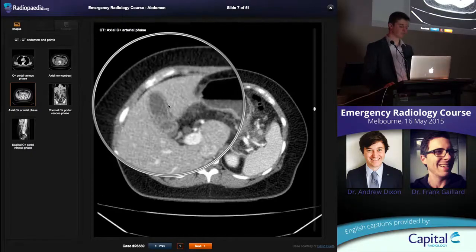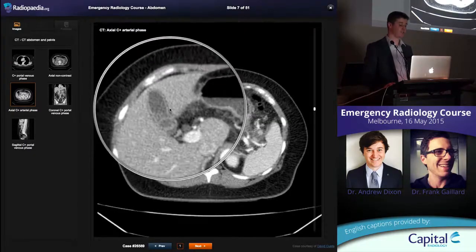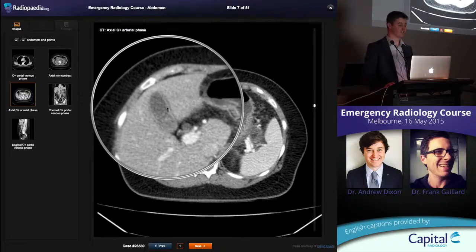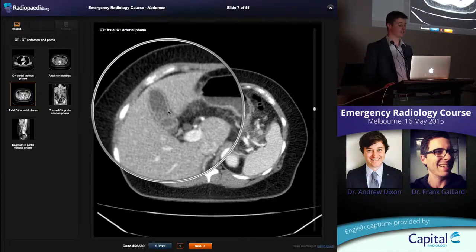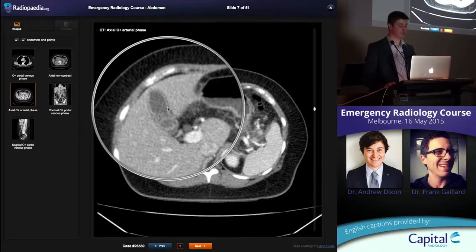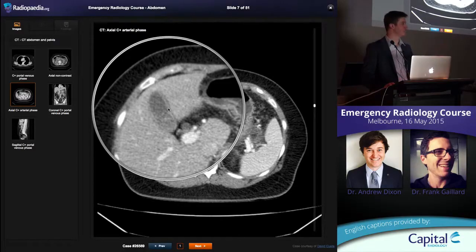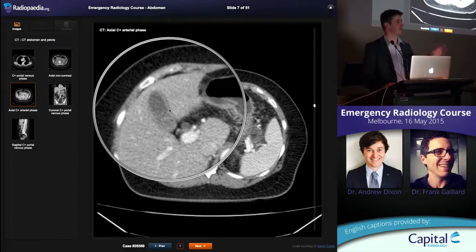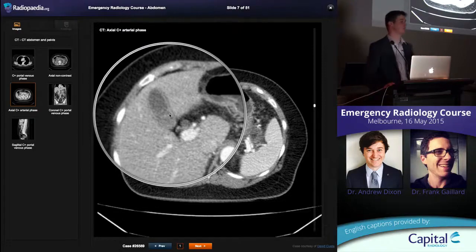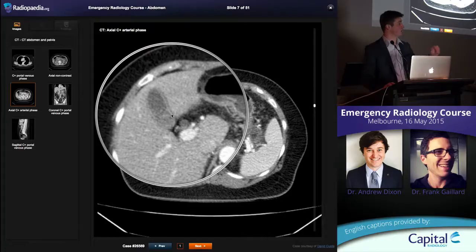This is worth noting. See this patient's gallbladder sitting here. So how earlier I said you have that mucosa enhancing. You just see a little bit of thickening around. See that little extra edge, extra line outside the mucosa. A little bit of wall thickening, a little edematous. Very common for the gallbladder to get inflamed secondarily to an acute pancreatitis. So if you do an ultrasound, you might see there's thickening of the gallbladder wall.